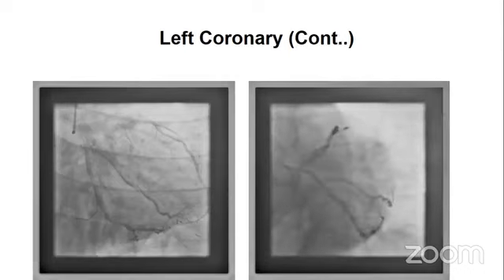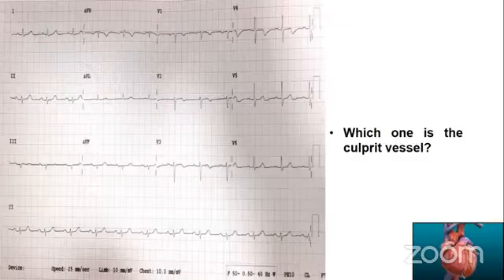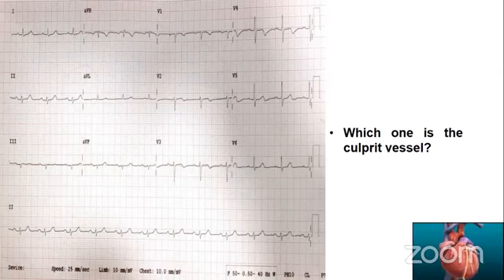In case of Wellens syndrome, another thing you should remember is that there will be an R wave. The R wave does not disappear. But Wellens syndrome may transform into full-blown anterior MI, and then you will get Q waves in the anterior leads. At that point, if you have no other choice, you can give lytics, but not now. You should have flexibility of mind, look at the ECG and repeat the ECG.